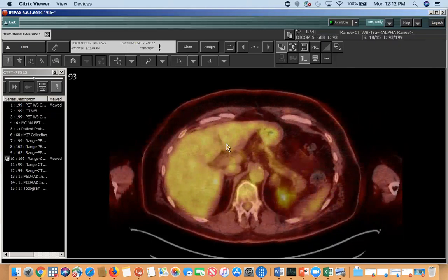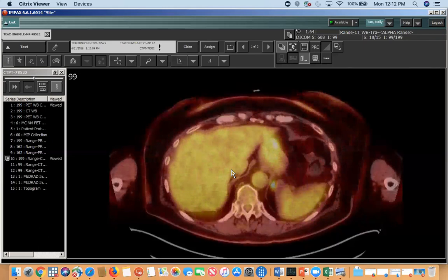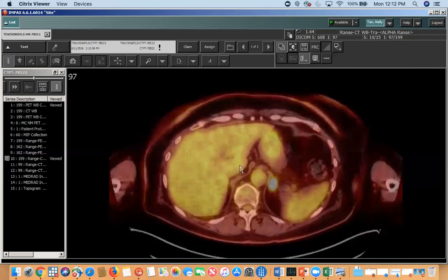The old exam is usually helpful. Yeah, exactly. It's possible, but in this case, the patient didn't have that. But if it's heterogeneous, it should still all drop out, right? That's what I'm asking, because a lot of adenomas I see, you don't see the whole thing drop out. You see maybe some areas, but other areas that don't. I see. Yeah, it's possible.